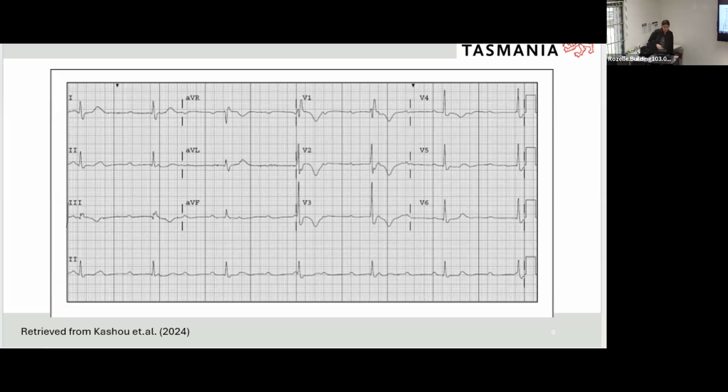So effectively, if we're looking at especially V1 to V4, we know that those leads are our chest leads. Rather than repolarization happening from the ventricles up, we potentially know that direction is now happening away from those leads. Especially if we look at lead 3, which is very suspicious. Sorry, lead 3 is this side. We know the direction is now happening away from that side as well.